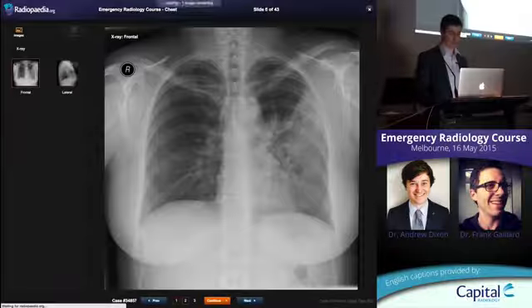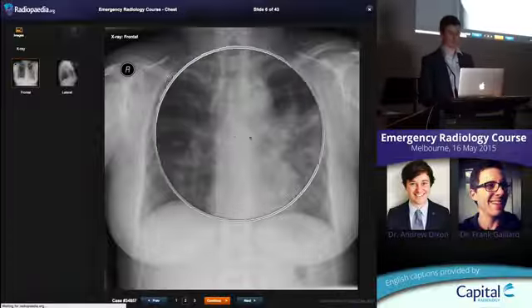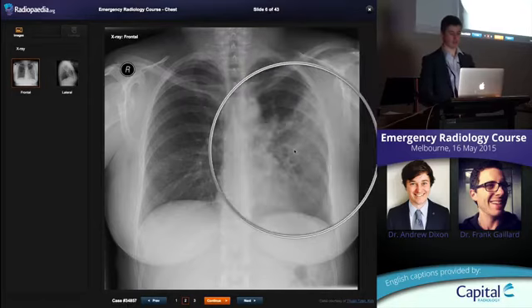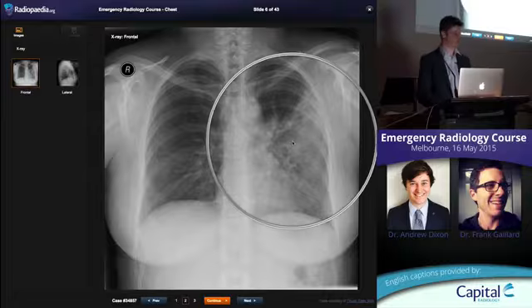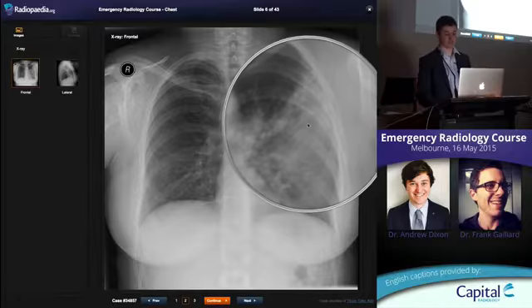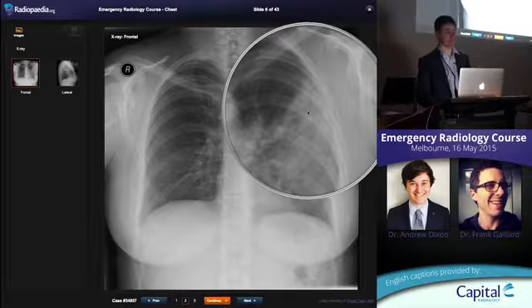Fever and shortness of breath in a 32-year-old female. So we're going to put this into practice, and we're going to say there's obviously an opacity in this mid-zone here, okay? And when we look at this opacity, obviously we can't trace the blood vessels through there anymore. I'll just zoom in, sorry. Can't trace the blood vessels, but what you can trace is maybe some little black branching things. You see that there? Black branching thing.